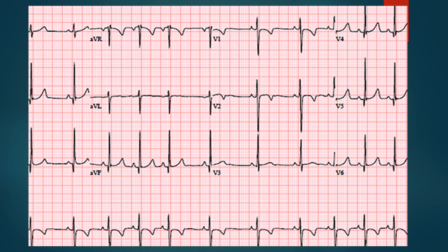In another example, here we can again see what the equiphasic wave is. There are two leads which have positive as well as negative deflection, lead 1 and aVL, but usually lead 1 is the most equiphasic of all, and the perpendicular lead to lead 1 is aVF, and aVF has positive deflection.